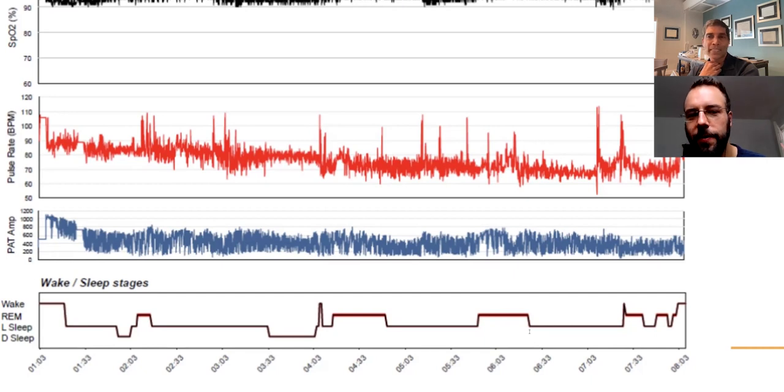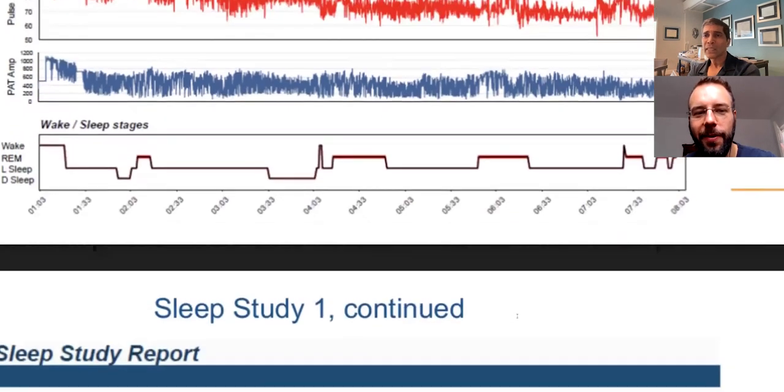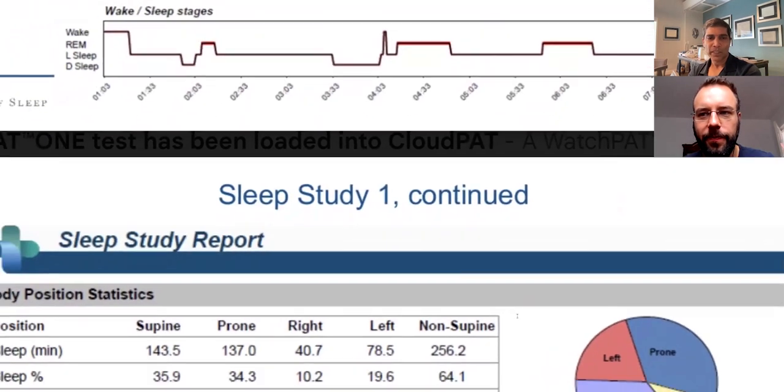But what I'm saying is that's unusual. I'm actually questioning the validity of this WatchPAT, as you can tell. And like I said, I'm reading this live with you on CPAP friend. So it doesn't make sense that you would have 65 potentially cortical arousals and only 2 actual awakenings, of which this patient may have remembered 0. It doesn't fit. This is someone I'd actually get a proper overnight study on. Interesting. But let's keep going just because we want to be complete.